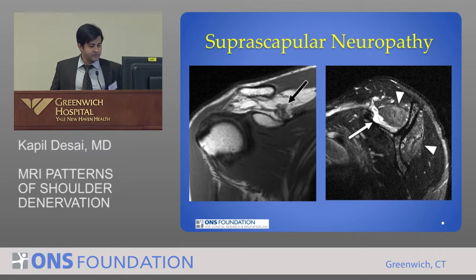Another example of suprascapular neuropathy here: this patient presents with upper extremity weakness. We see the same findings again. Supraspinatus and infraspinatus muscles both bright, abnormal compared to the normal signal subscapularis muscle more anteriorly. These are bright edematous abnormal muscles. And what we see here is this weird vessel coursing through the exact course where we expect the suprascapular nerve to be. On the T1 image, we see this tangle of vessels that shouldn't be here. This is a varix, a small little benign tangle of vessels that was causing problems by pushing on this nerve in this patient.